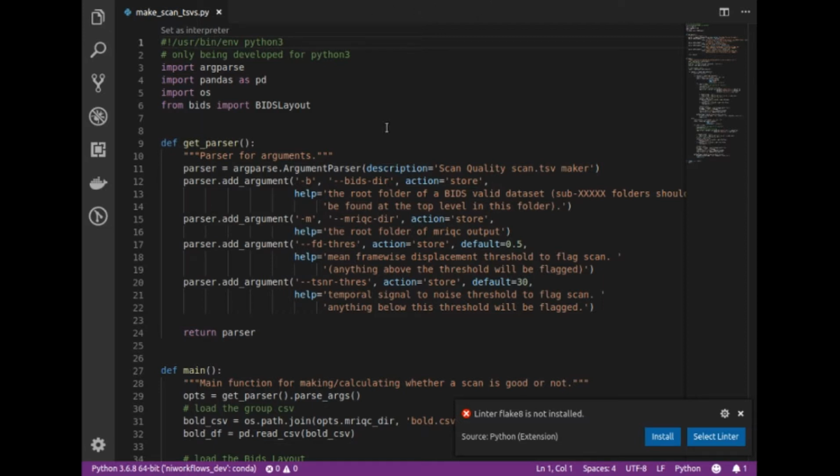But I think I might need to, if I do that, let's go back in here. If I did do that, I need to make this an actual function that I connect to the workflow, and then I would make that a node, and then I would still connect this genref. Yeah, it's still used. Okay, so I'd still connect this genref to that node that I made with n volumes to discard, and I would compare that to the input to that node, which would be the manual number that the user specified, and then I would generate a warning or not based off of whether the n volumes to discard was greater than the skip vols num that was specified. Alright.